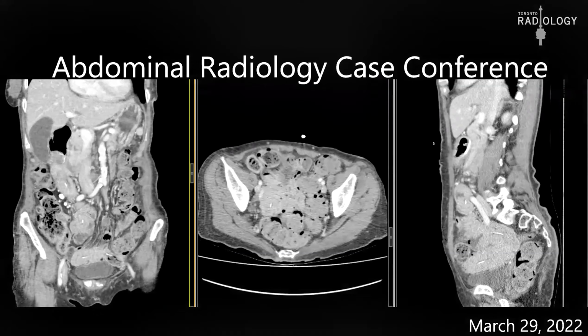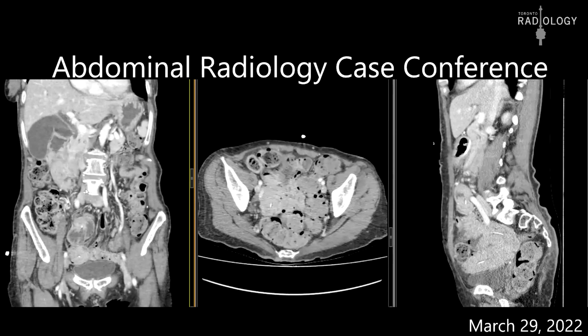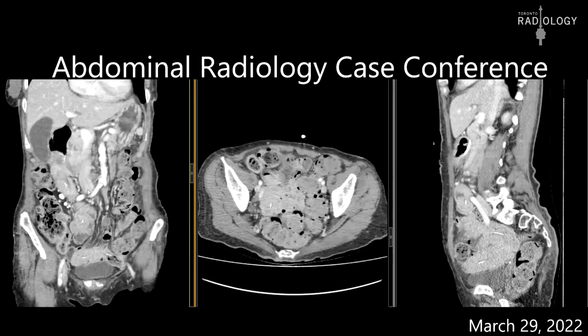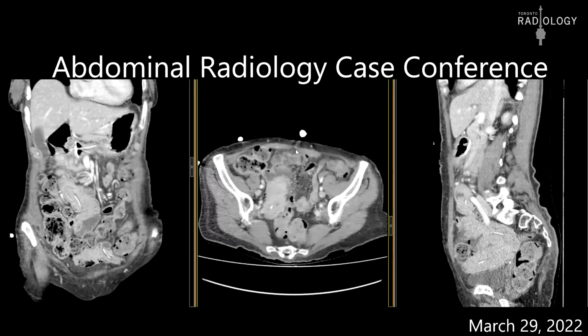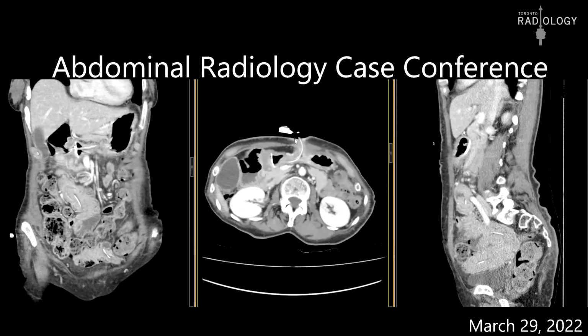So that raises a few questions. First of all, how can a tube migrate distally? Because the tube is always going to be fixed at the skin, at the entry point, where they're going to have sutures. So unless the sutures are cut off and it's been totally pulled in, it can't. Or secondly, the tube has to stretch. Now, these tubes are not stretchable. You can't stretch the tube. So the length of the tube inside the bowel is the same.